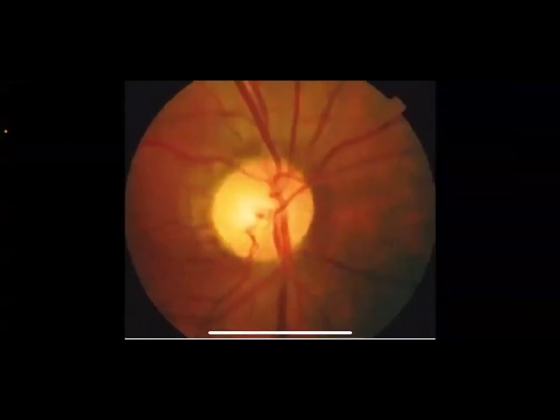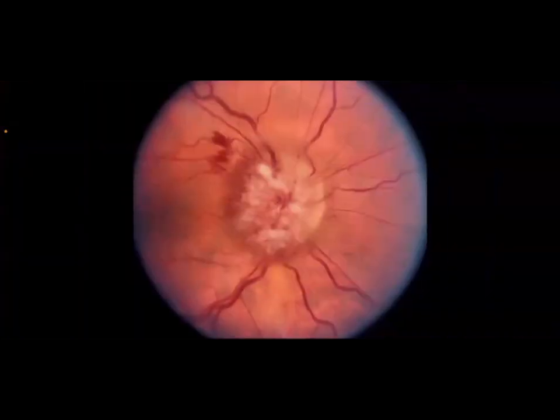This one is optic atrophy because the margins are clear, sharp, well demarcated, and the optic disc is shining like a moon, like a lamp. But if you see this one, where are the margins? The well demarcated, sharp margins we know about the optic disc are not here, right? You can see the vessels gathered towards the center. This is the area where the optic disc should be, but I cannot see the optic disc.